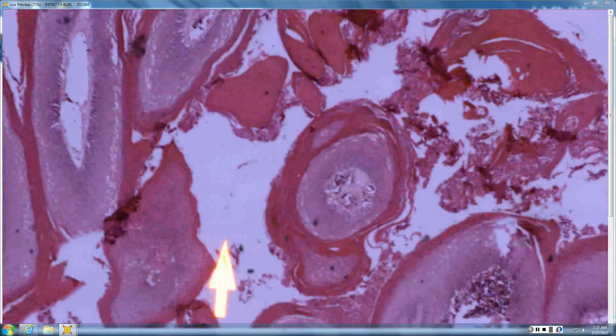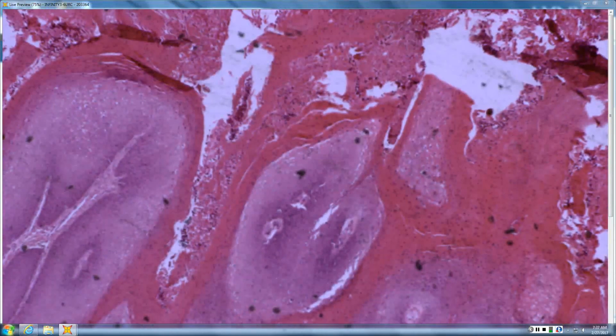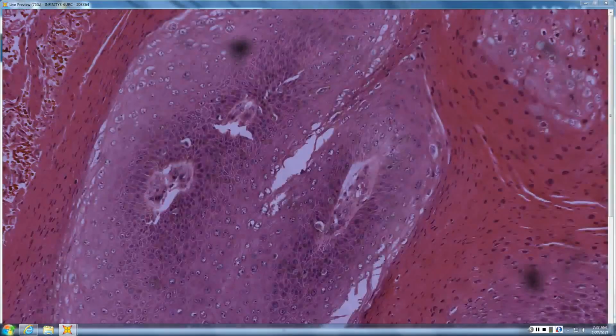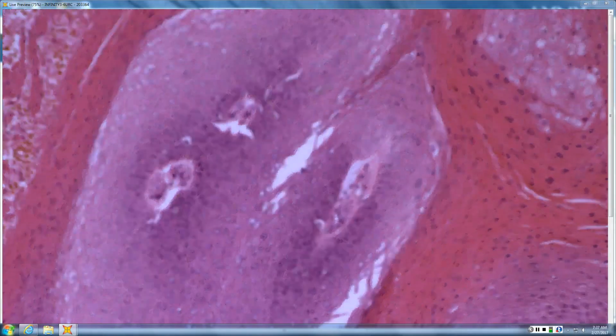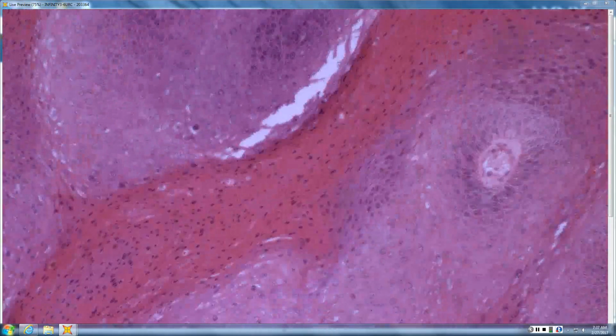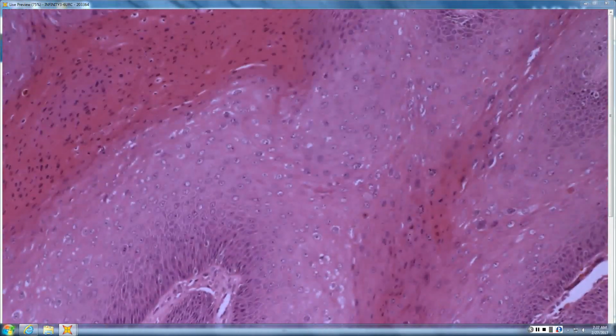This, by comparison, would be a more typical condyloma. Broadly acanthotic. Again, the stratum corneum is exactly the same as what we saw in the one that looked like a seborrheic keratosis. Compact or coarse basket weave, distinctly round parakeratosis, but coilocytes are present.